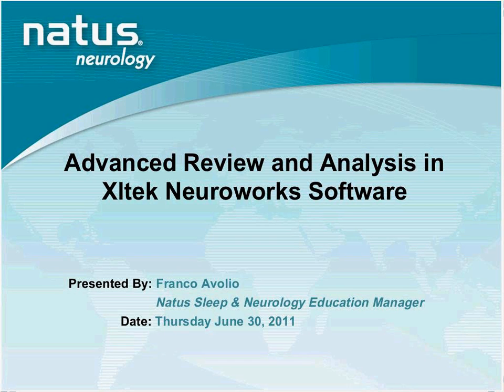Some may consider these advanced features, others may not, and so I apologize ahead of time if you find some of these features a bit redundant, but for some of you, I know this will be new. The software that I'll be using today to demonstrate the features is NeuroWorks version 7. So if you do not have the latest version of software, you may notice some of the features are not available in your version 6.1 because I'm using a newer version.